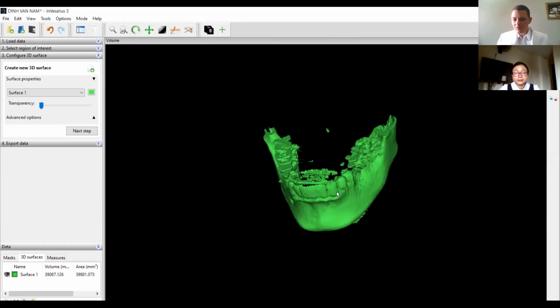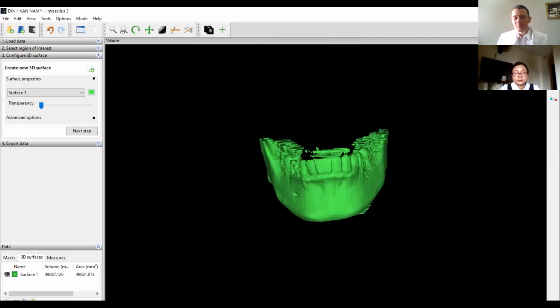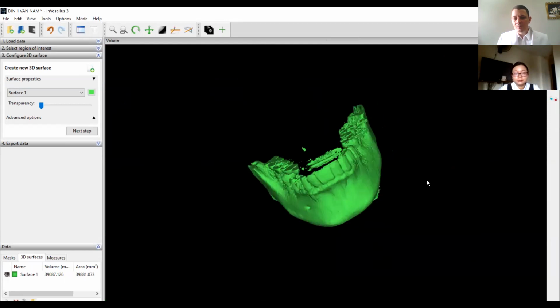So here, right, if you do a left click, you can turn around.